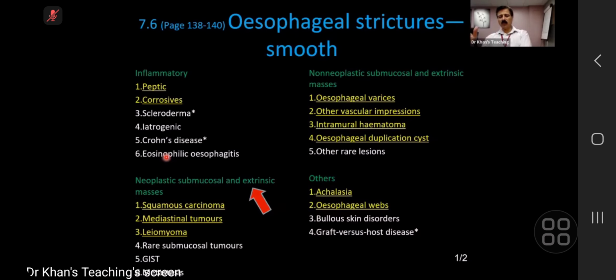So we are not very good. I remember it like this: if you find a frank malignant stricture in the esophagus, like mucosal destruction, shouldering, etc., you are very confident that this is malignant. When you find a smooth stricture, you should still keep malignancy in the differential. And I have seen quite a few, particularly those coming from outside, something sitting in the mediastinum, small cell carcinoma and things like that, and secondary invasion of the esophagus.